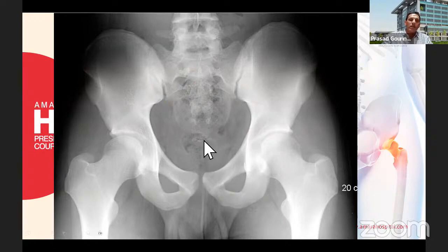The distance between the sacrococcygeal junction and the symphysis is more than the ideal 2 centimeters, so it's a little bit of an inlet view. You can see the foramen is smaller than the bigger ones you see normally. So this is a slight inlet, slightly right rotated X-ray. When you see this, you don't have to automatically send them back for a perfect X-ray, but you can make some adjustments mentally as you gain more and more experience.